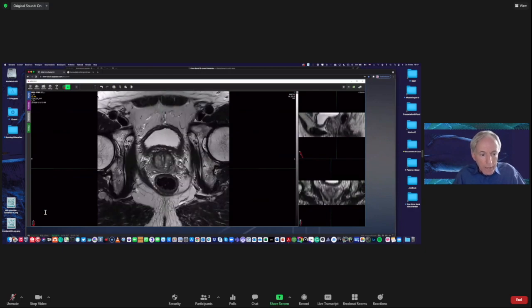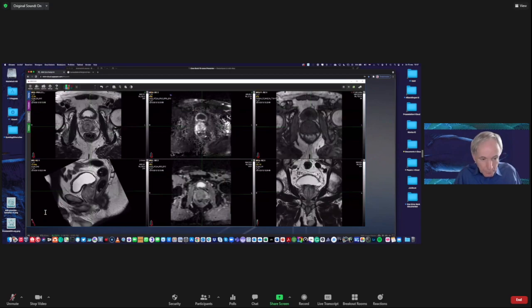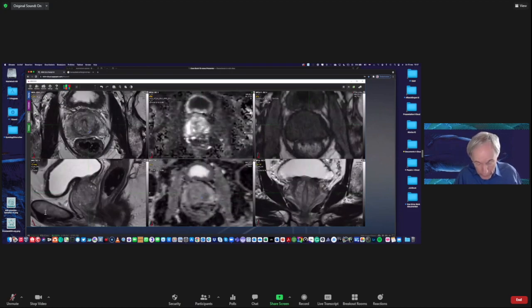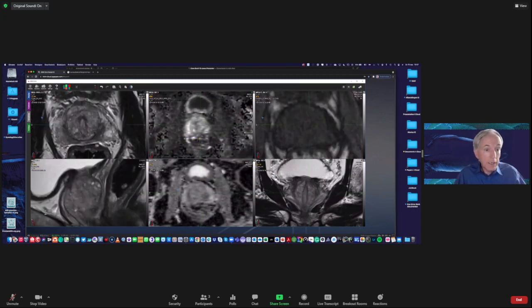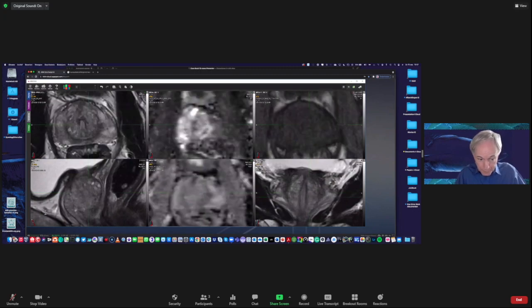So what I'm going to do then is to zoom in on the images. That's what I usually do. I zoom in. And the other thing is that I try to window and center the B1400 correctly. So let's try to do that. Now this is the correct window and centering. Zoom in a bit again, and let's have a look at what is going on in this patient.